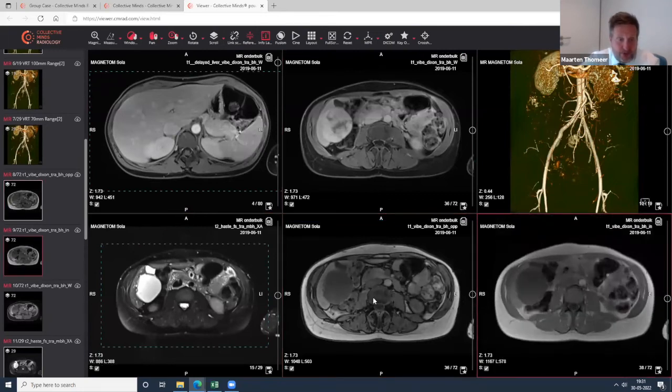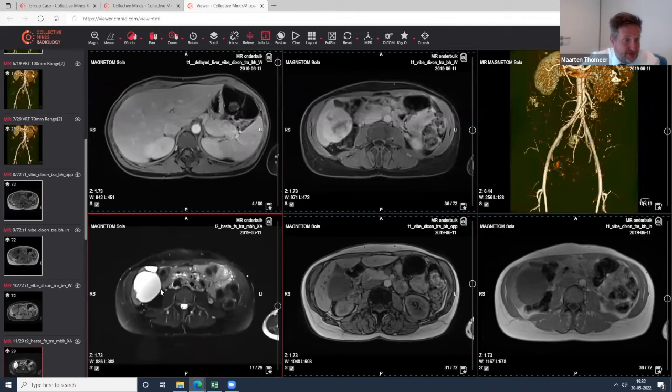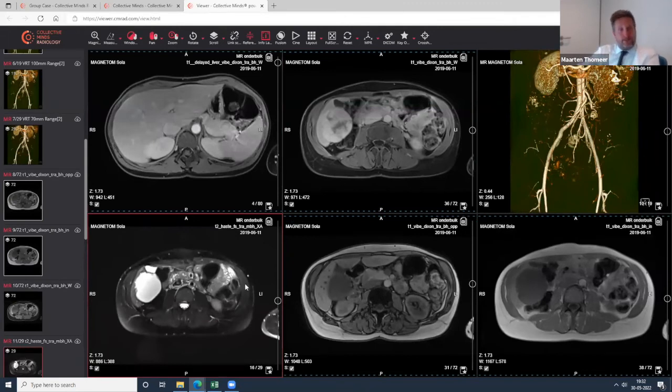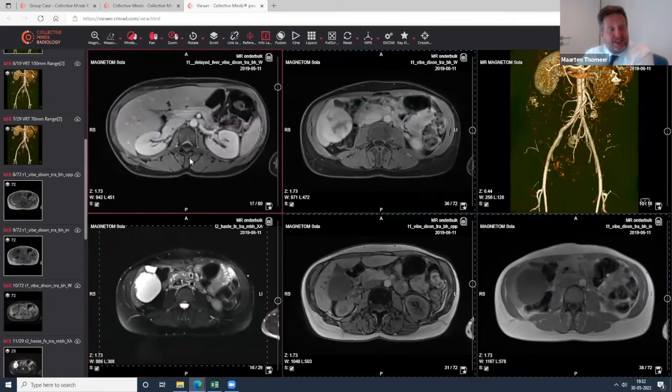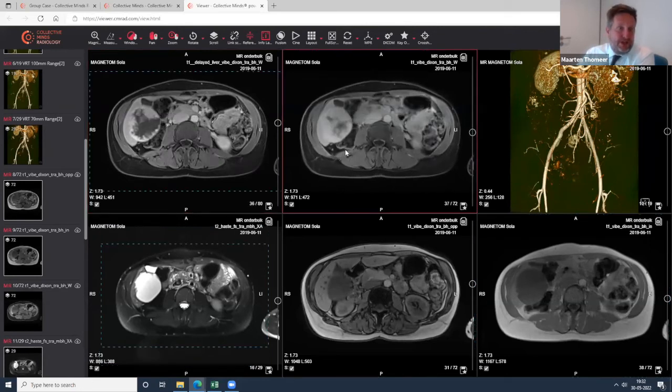The lesion is hypointense to the surroundings, so it cannot be an FNH, adenoma or HCC. It's extremely hyperintense, as hyperintense as the gallbladder lumen. So it's a fluid lesion. But it's a fluid lesion which enhances peripherally and a little bit nodularly. And in the later phase, there is the centripetal enhancement. So this is a clear diagnosis of a hemangioma.